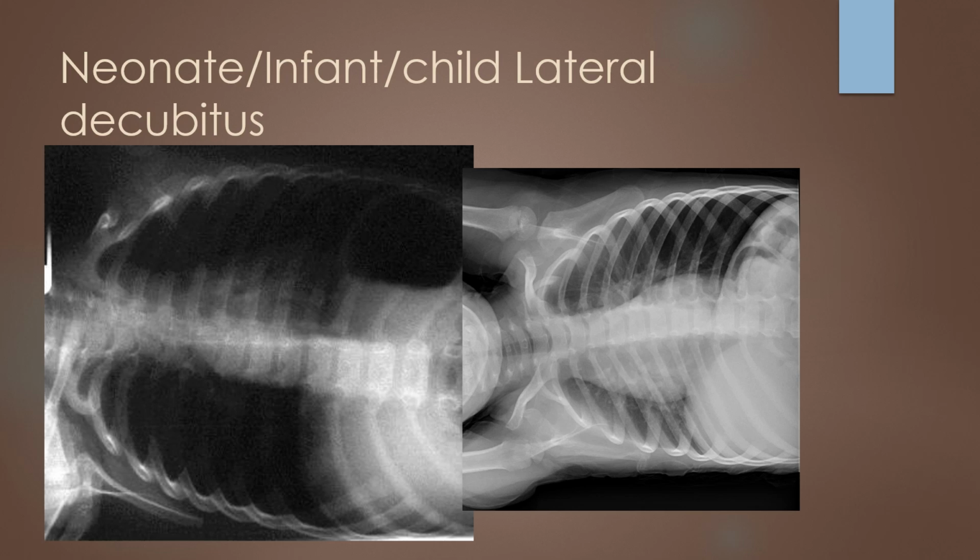Okay, so here we have a couple things to evaluate. So first thing I'm going to draw your attention to is over here. First, we're going to look at anatomy. So I have apex to angle, angle to apex. All the anatomy is there. Secondly, I'm going to look at the legalities. So let's go ahead, and I do not see an upright marker or an up marker, that we should see something like this. And it does look like patient information is flashed right over here, and I do not see a left or a right side marker. So we're missing markers. That is concerning, but it looks like our other legalities are here.